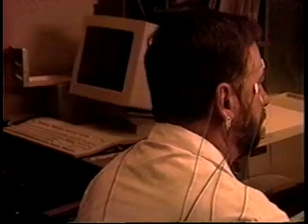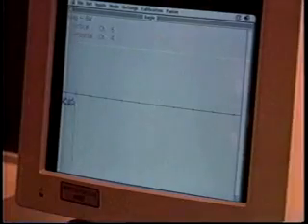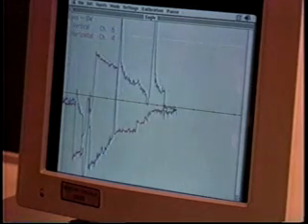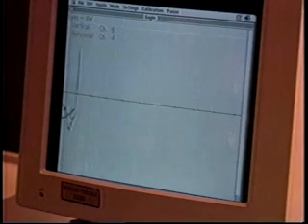The signals measured by the electrodes track eye and head movements. The electrodes allow us to determine the position of the eyes relative to the head. The top and bottom electrodes indicate the vertical position of the eyes and the head. The left and right electrodes indicate the horizontal position of the eyes and the head.